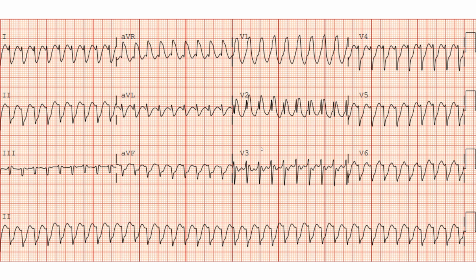The next one is the Brugada interval, which is the time frame from the beginning of the QRS to the peak of the S wave in the precordial leads. And this one's pretty long. Okay, so a couple things. I've shown this EKG to a couple people, and they get confused by V3. They're like, oh, well, V3 looks narrow, so this can't be a wide complex tachycardia, and that's false, all right?